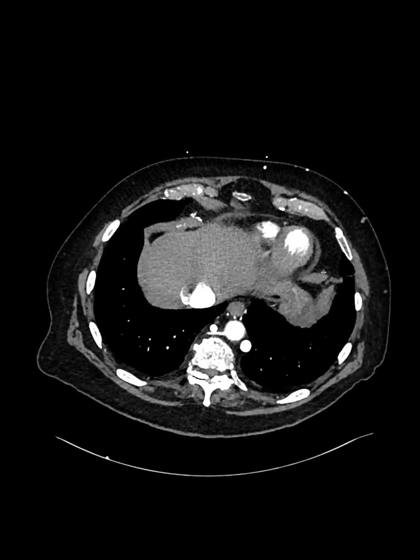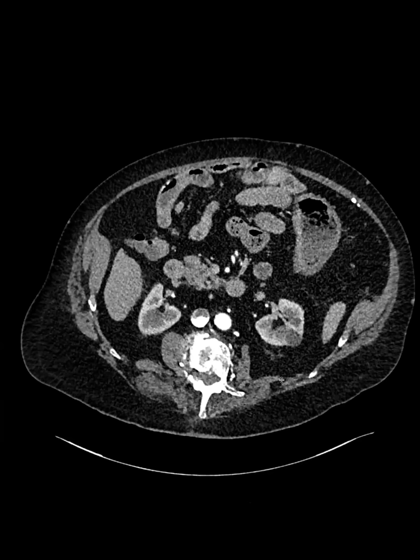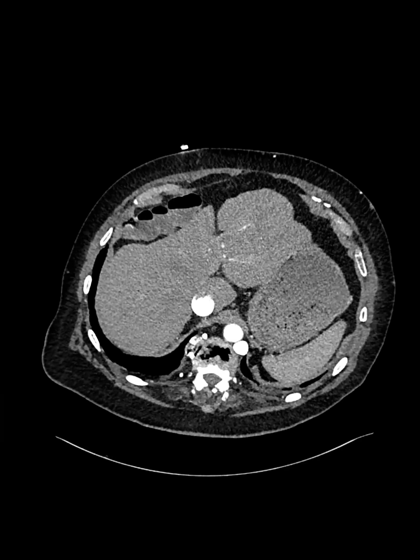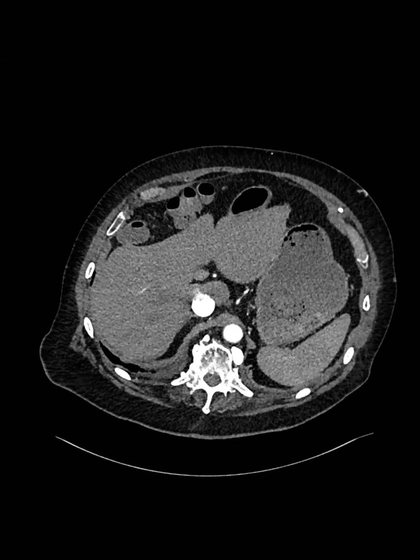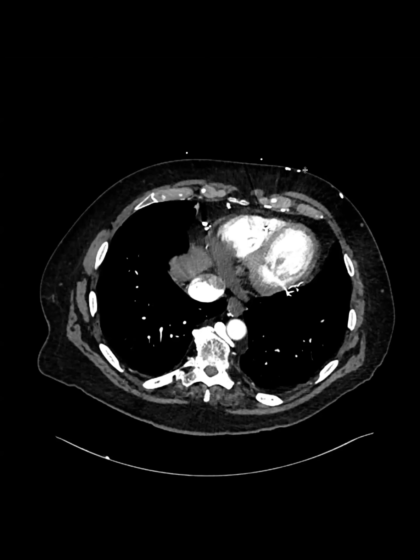Right, so because of the SVC stenosis, there's this distribution of contrast. We don't normally see this much in the IVC, but we're seeing all of these sequelae, and you can see there are huge collaterals that formed to try to reroute the blood flow. And so this is benign. It's not pneumatosis. It's just administered air that was in there. So it's just a fake out. Cool. I'm not even sure I would have picked that up the first time.